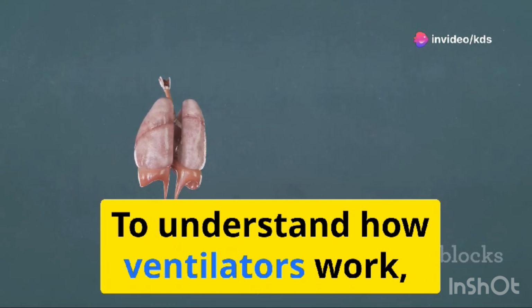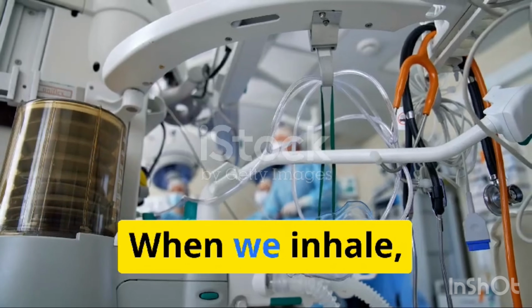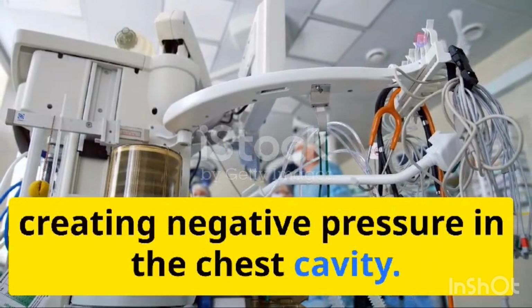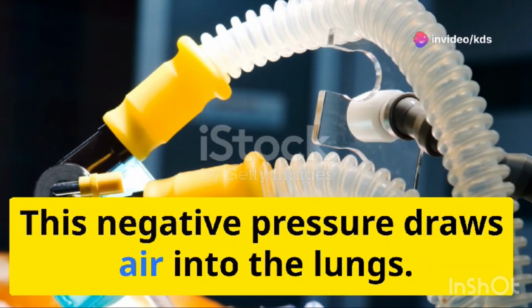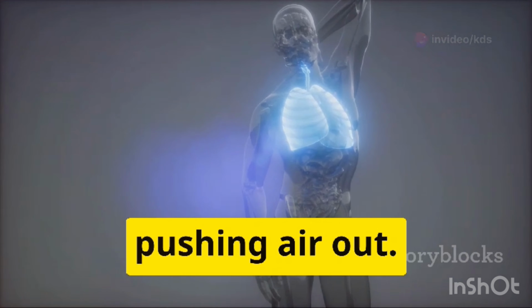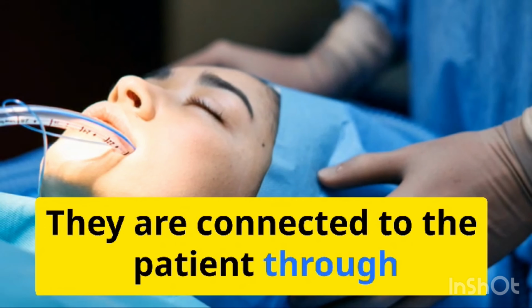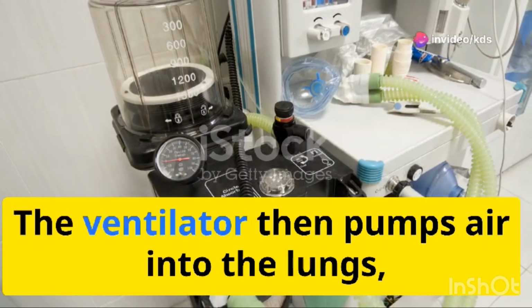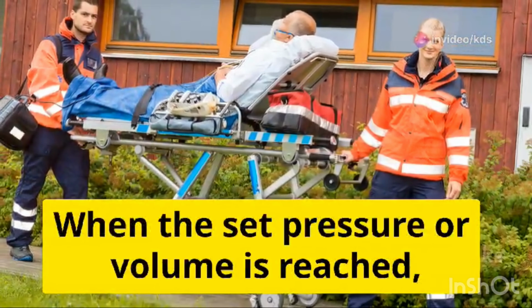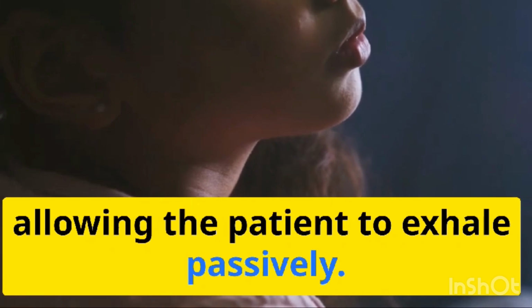To understand how ventilators work, it's helpful to first understand how we breathe naturally. When we inhale, our diaphragm contracts, creating negative pressure in the chest cavity. This negative pressure draws air into the lungs. When we exhale, the diaphragm relaxes, pushing air out. Ventilators mimic this natural process. They are connected to the patient through a tube inserted into the windpipe. The ventilator then pumps air into the lungs, simulating an inhale. When the set pressure or volume is reached, the ventilator stops pushing air, allowing the patient to exhale passively.